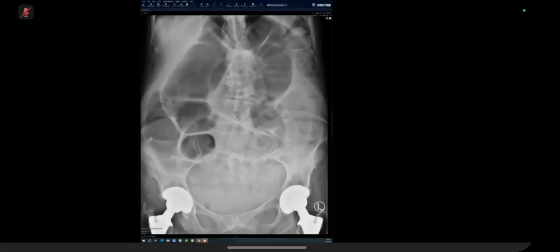Yeah. So if you think that's the right, I agree that's the right ascending colon, and then where does it go? And you said there's no gas in the rectum. Maybe the distended bowel in the center of the abdomen corresponds to the transverse colon, because I can see it approaching the course of the left of the transverse colon and traversing in the left paraspinal region.